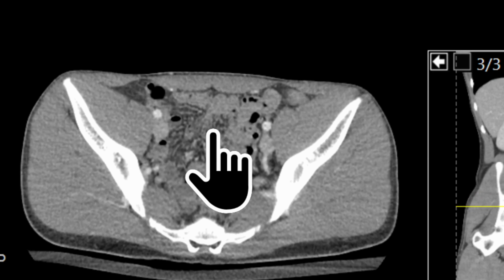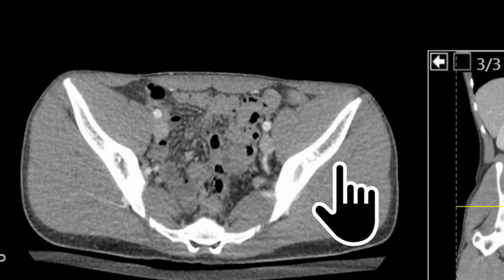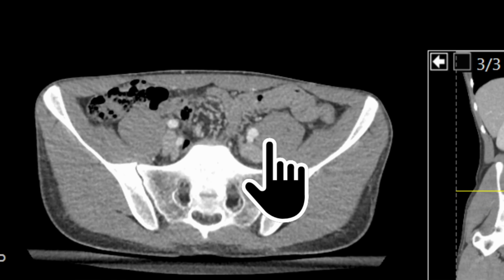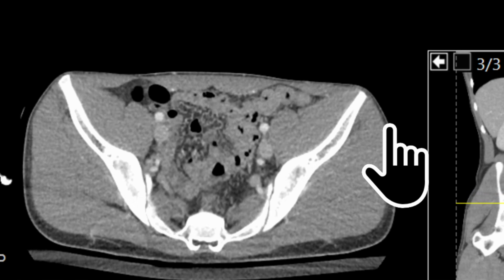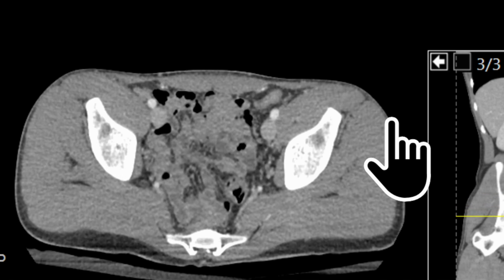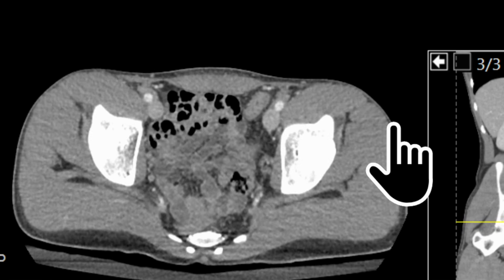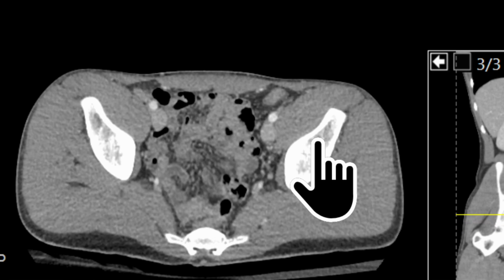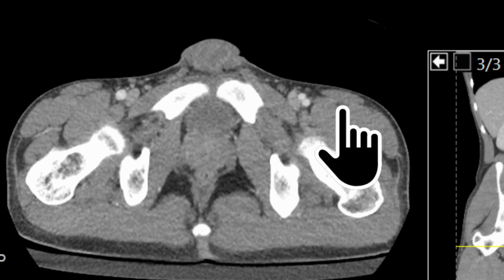So our common iliac arteries, keep an eye on them as I scroll down and watch where they go. So the external iliac arteries are going to run anteriorly, and scrolling back up, the internal iliac arteries, they're going quite posteriorly, aren't they, to get into the pelvis. And we'll save the pelvis for another day, but those are going to supply blood to the pelvic structures. If I keep going down, they're going to become the femoral arteries and go to the lower limb.